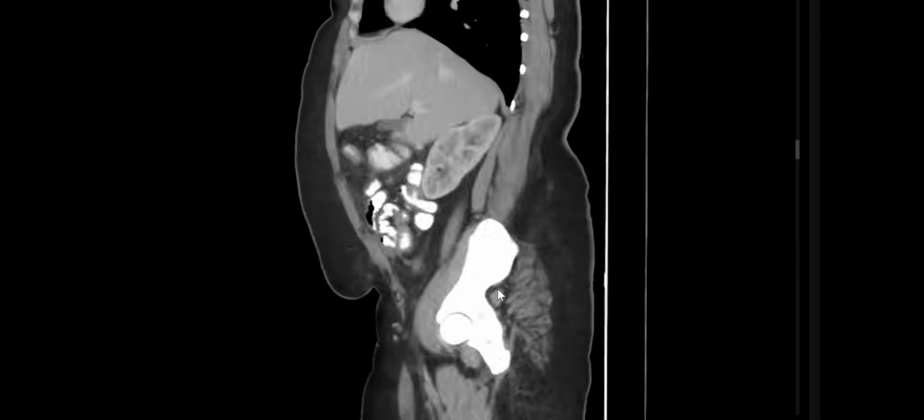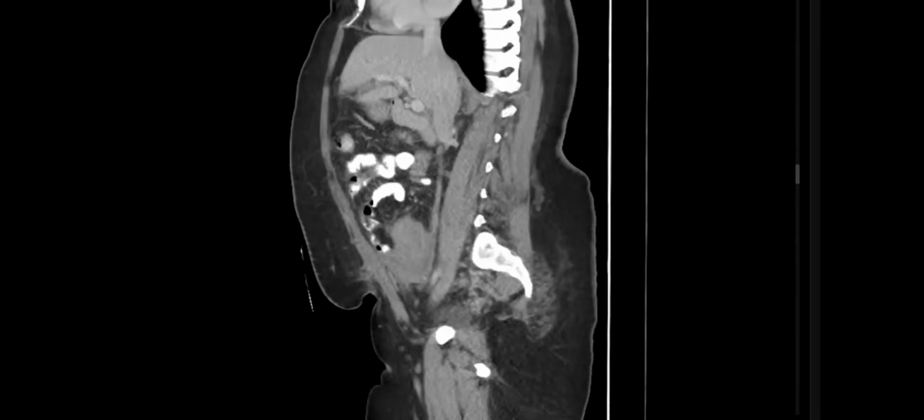Just give me the mouse. Okay. Yes, sir. Very good. It's a case of endometritis. Commonly, yes. I'll talk about dehiscence in a few seconds. Okay.